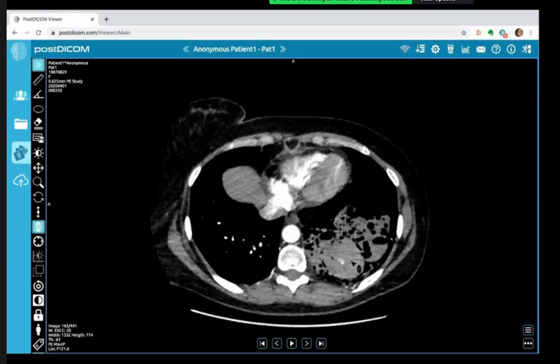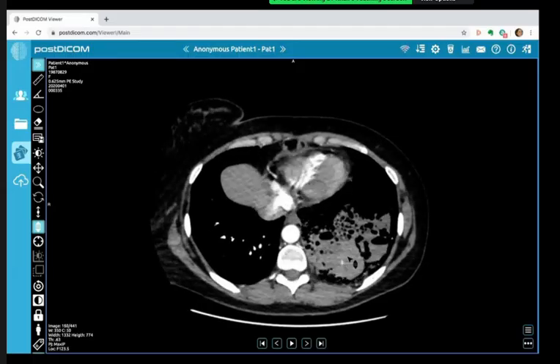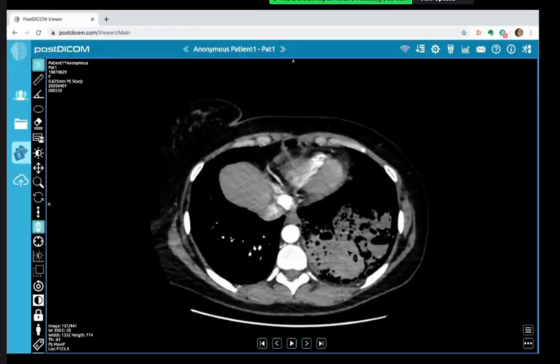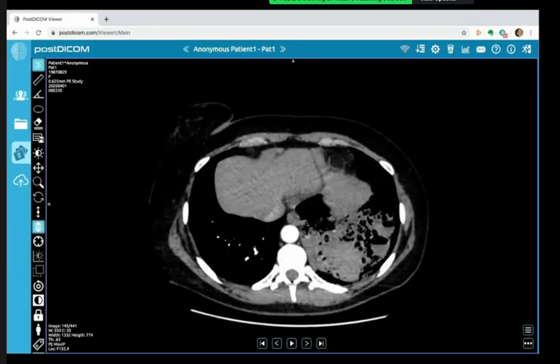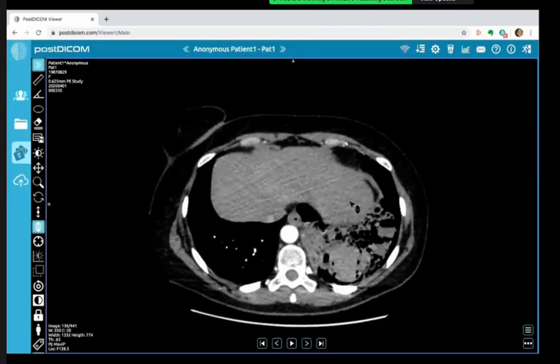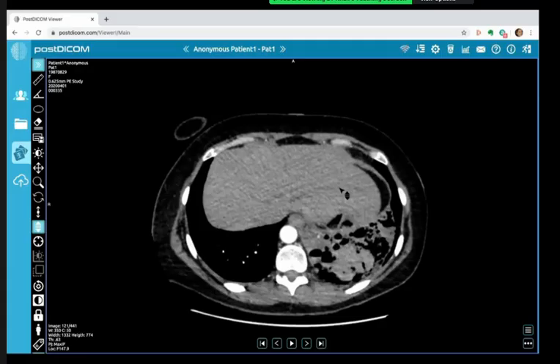So we're going to follow this vessel medially. Yeah. Okay, yeah. So it's opacifying at the same time, in its arterial kind of enhancement. Yeah. And I'm following it immediately.